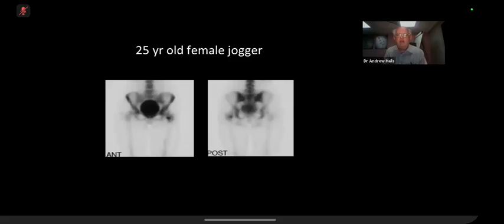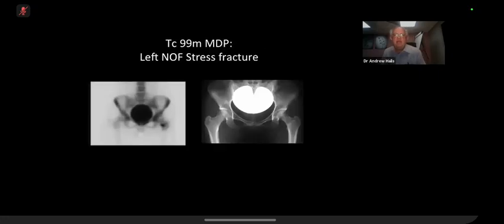Right, okay, so this is, I'm going to ask you about it. So it's a jogger who got increased activity, and it was again a stress fracture.